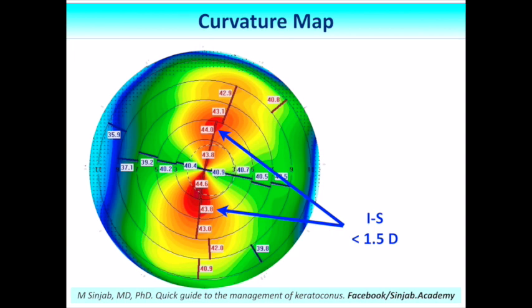Of course, these numbers are rough, and I'm mentioning such numbers just to make reading the topography and tomography easy. But of course, there are indices, there are some numbers that will be mentioned in details when I will talk about classification. But now I'm just talking about very quick and very general look at the maps.